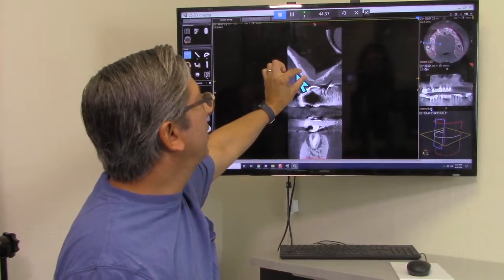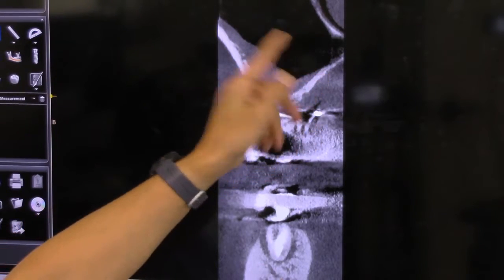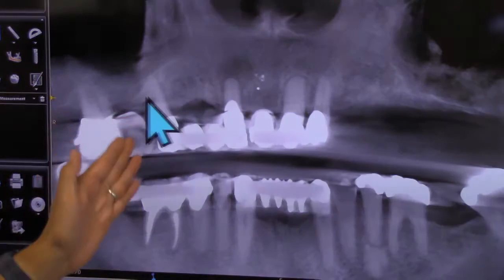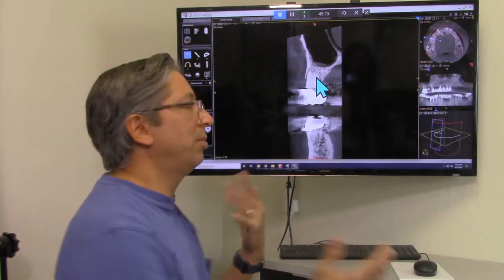So everything has to be fairly low, and usually they can do a pretty good job of about this much width going in and then filling the entire sinuses as far as they can, so that bone will mature into that area. So let's skip that site because I'm not interested in that, and let's look at this tooth site here, the next site over. I'm interested in trying to get people teeth back than trying to do heroic surgeries. And here's the first site that we have that could mature more easily and more predictably for an implant.